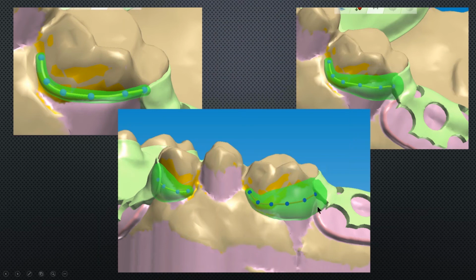Also in this area here, we're going to be setting a denture tooth. In setting that denture tooth, we want that to be nice and flat so that we can abut that denture tooth pretty darn close to that adjacent tooth. That's why we're going to be at about 4.5 millimeters in this area, slowly tapering down to more of a pinpoint type clasp on the tip. On a premolar anterior, you might be 3.5 to 4 millimeters tapering down, whereas the Zerlux acetal, you are going to be more like 3 to 3.5.